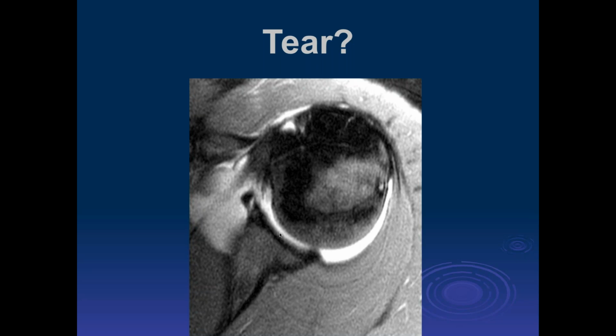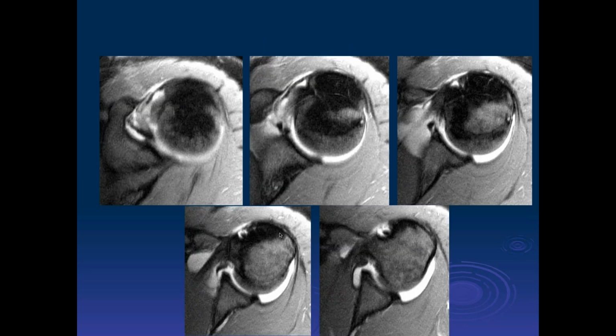Okay, so let's look at a bunch of images here. There are a series of images.